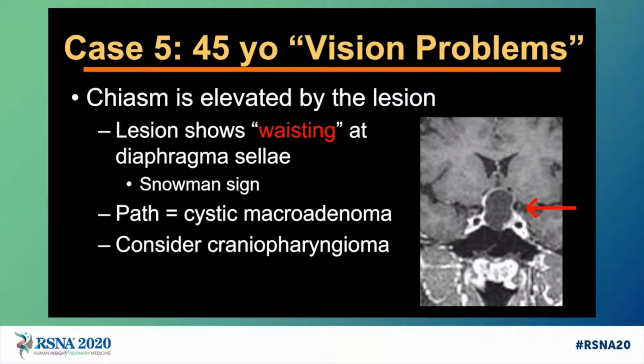At pathology, this lesion turned out to be a cystic macroadenoma. Not unexpected. I think it would have been reasonable to consider craniopharyngioma, but craniopharyngiomas are more common in a younger age group.